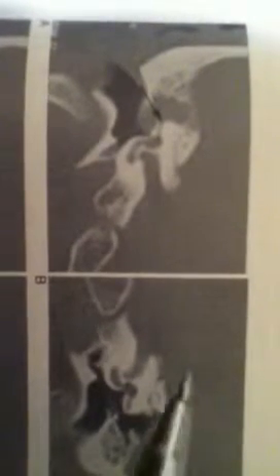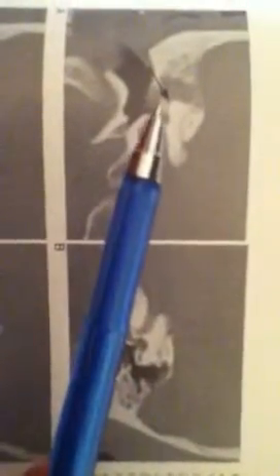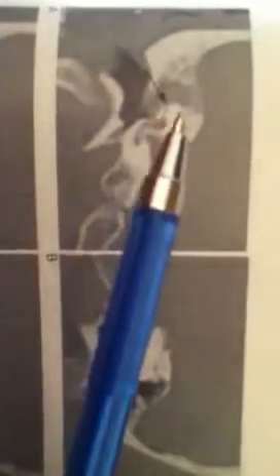So we can see here the lower attenuation present here is absent here, and it is filled by a mass of higher attenuation than in the normal picture, and this mass causes erosion of the semicircular canals, and this mass also has destroyed the ossicles, there are no ossicles here, and covers part of the oval window on which the footplate of the stapes is normally located.